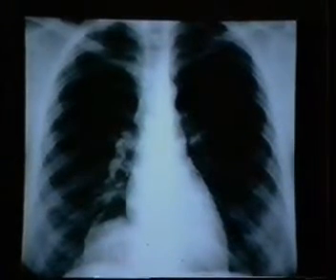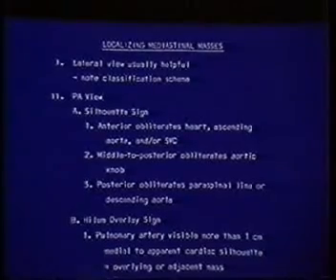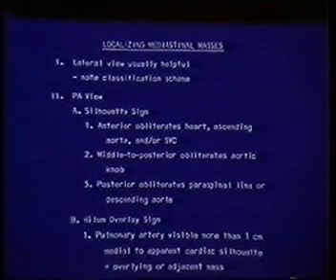This lesion clearly has to be anterior because of silhouetting the heart border, and it's useful to know that ahead of time because on the lateral it's quite hard to pick out, although that will be relatively true of low anterior mediastinal masses, which are overlapping the heart, and high posterior mediastinal masses. If you can figure out where they are, that's useful because the lateral is often not helpful in that situation, secondary to all the overlying bones of the shoulder and the scapulae and so on.